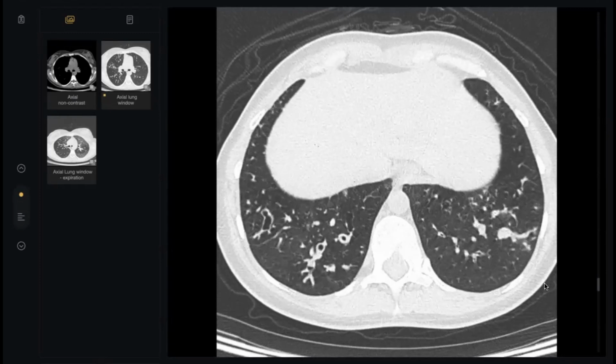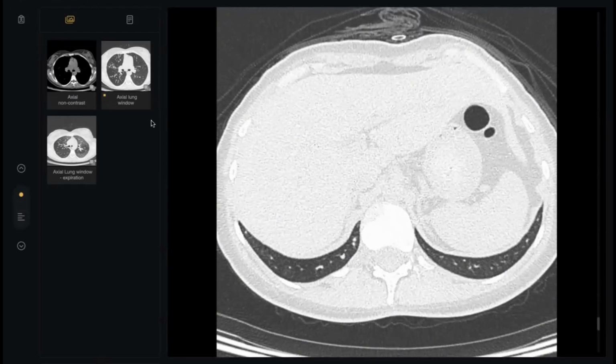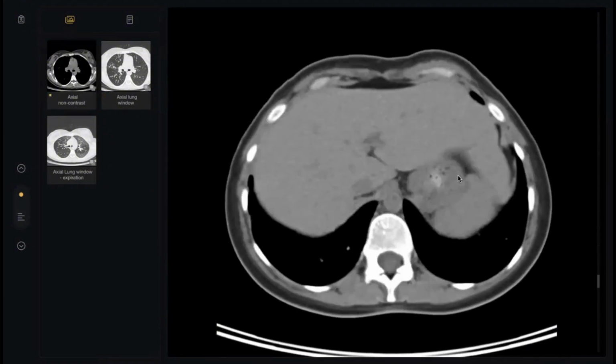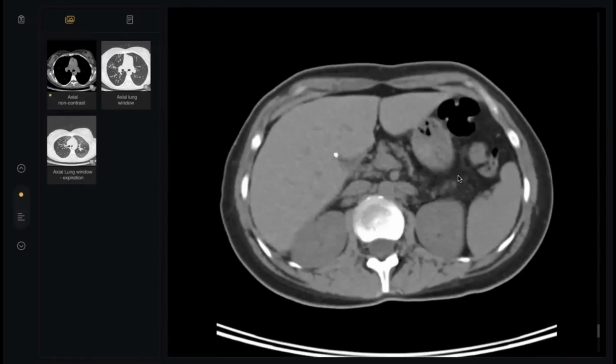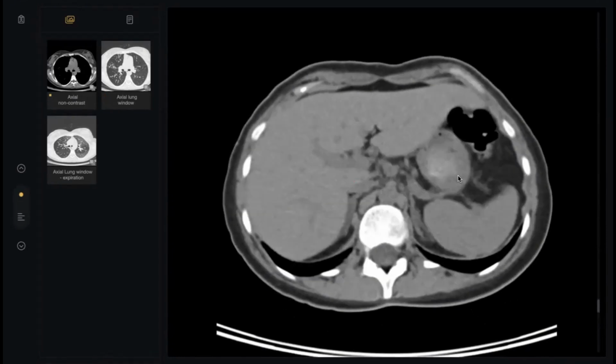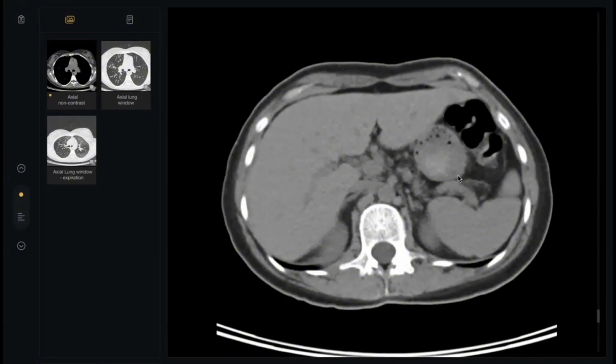Look here, please. Leave the mouse. Okay, sorry. What happened here? So there is cholelithiasis, so there is cholecystectomy. These are cholecystectomy clips. What else? The spleen is enlarged. Vessels appear prominent. There is some collateral formation. What else?